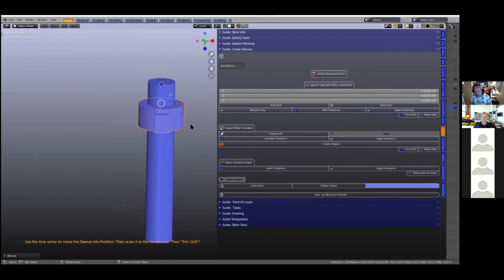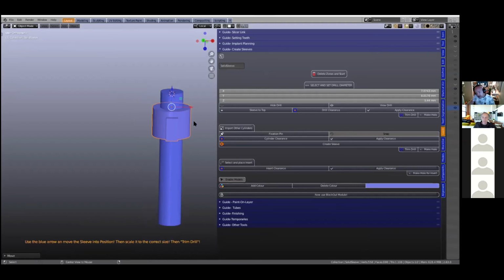And we should always keep this at no more than between 5 and 6mm long. That is because also if you want to use the metal guide sleeves, the cutting tools for those are 6mm. So we shouldn't exceed beyond 6mm. Exactly.